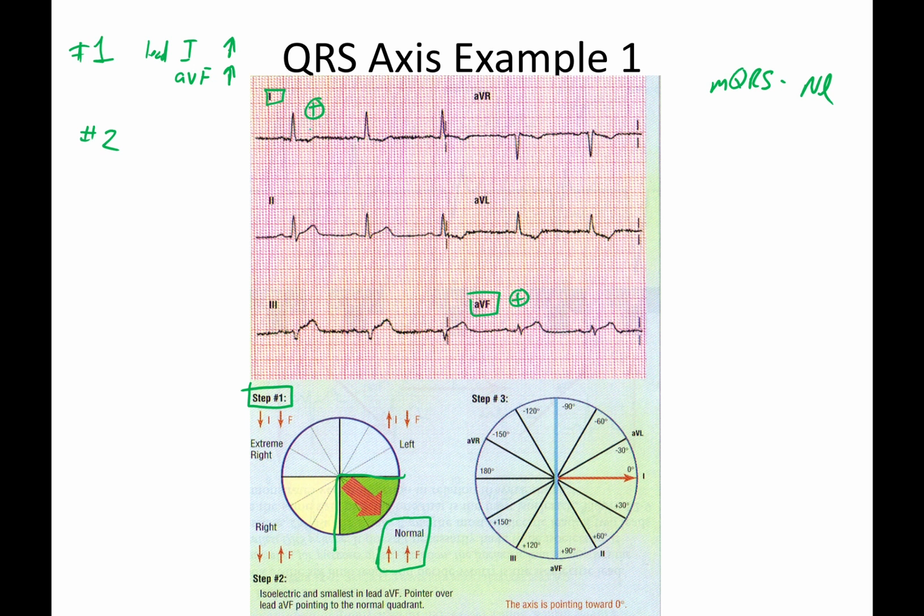So you can see how we have a nice tall R wave here. This one again is positive. This one here is negative. Doesn't even have an R wave at all. This one is really negative because that comes down quite a bit. And this one's quite positive. And then we're back to AVF, which we decided was positive, but honestly, compared to all the other leads you see, this one at least has a positive and a negative, whereas lead 3 only has negative.